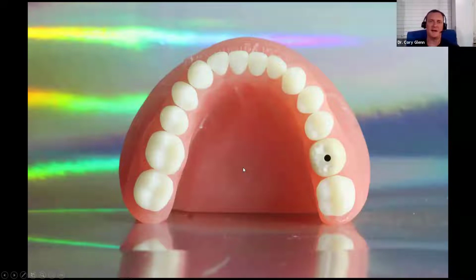And just a quick aside on that, the thing I would recommend if you're placing implants and you have an intraoral scanner is to do a pre-op scan. Go ahead and do a pre-operative scan of both arches and your buccal bites so that that's all done. And then come back before finishing up.